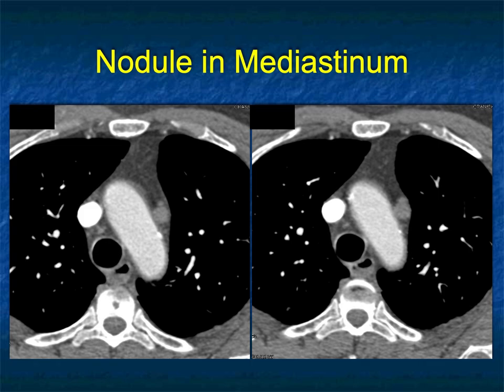If you were told the right history, that the patient had hyperparathyroidism, you would consider an ectopic parathyroid adenoma. One thing: parathyroid adenomas usually track down inferior to the thyroid, or are attached to or near the thyroid, and they're typically hypervascular. This patient had a lot of symptoms suggesting an ectopic parathyroid adenoma, as the parathyroid glands looked normal on the routine CT of the neck. So history is very helpful in this case.